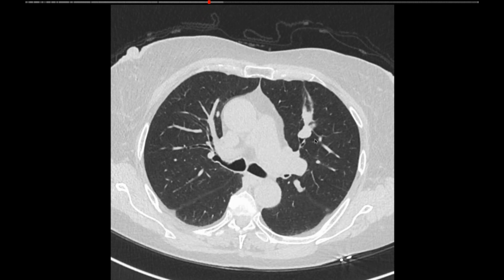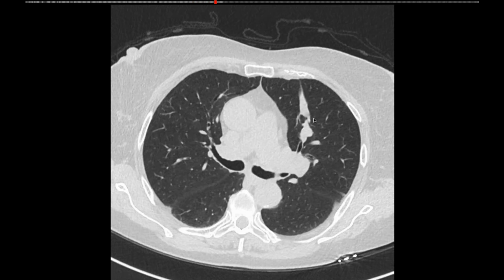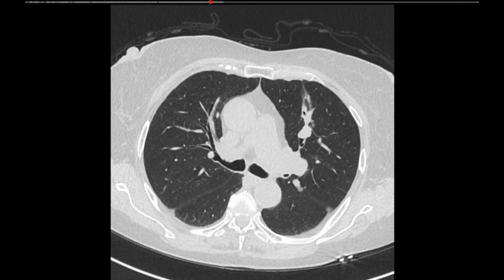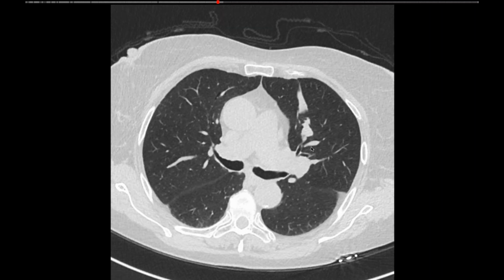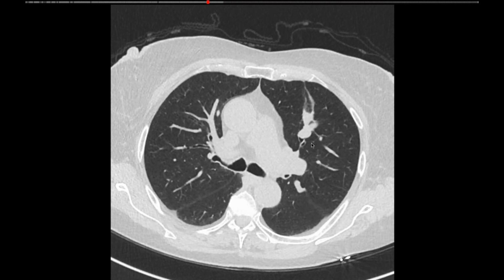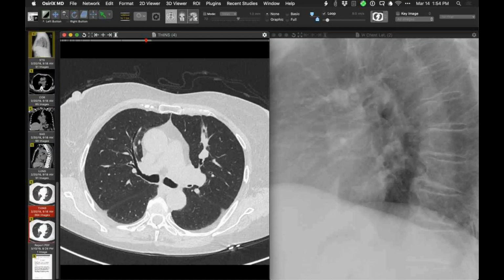And then in front, adjacent to the subsegmental atelectasis, we have another bronchus, bronchi filled with stuff, branching. So we have mucoid impaction. And then we can see how nicely this airway leads right into that lesion, and a bit of a so-called iceberg sign, potentially. So a nice endobronchial lesion growing in that location.